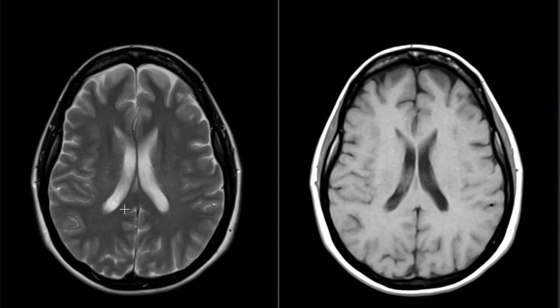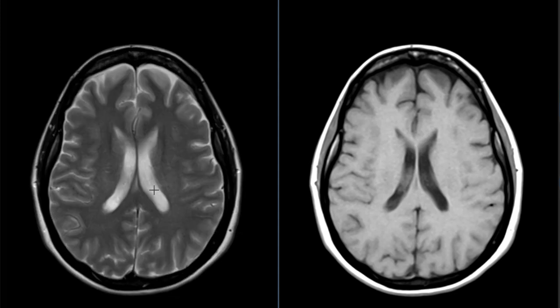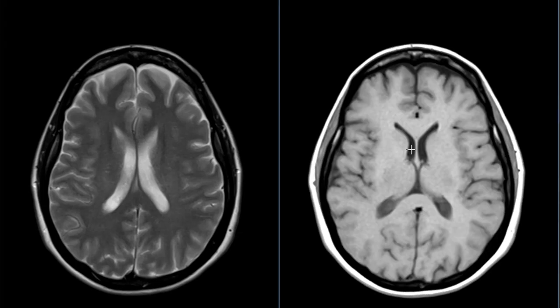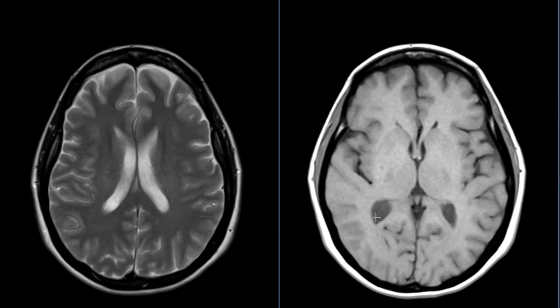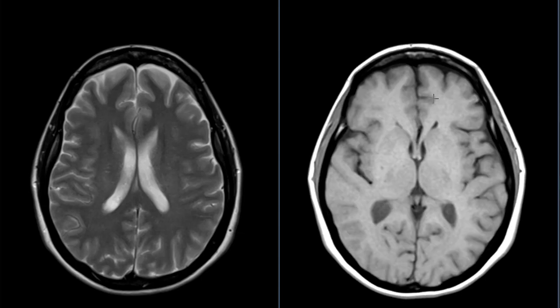So in this patient, we have a T2 weighted view. The fluid is white here, or really hyperintense on this view. Here it is of low signal or dark in the ventricles. And if we get back to the choroid plexus area, this is in the atria of the lateral ventricle where the choroid plexus sits. The choroid plexus is a vascularized tissue that secretes the CSF, or the cerebrospinal fluid, that surrounds the brain. Well, that tissue sometimes can develop cyst formation, and the cysts can become complex and look just like this. They call it choroid plexus xanthogranulomas.